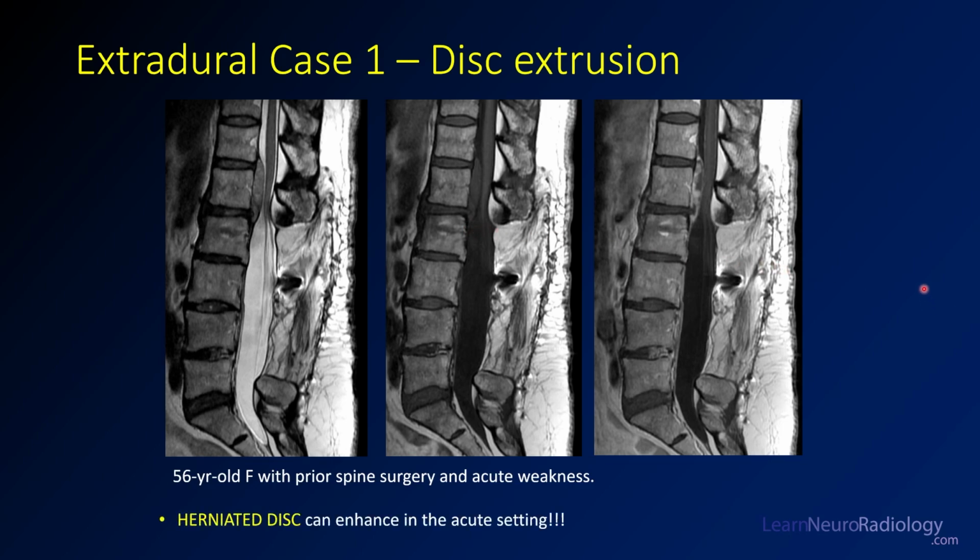Now, don't worry too much if they're enhancing. You can see particularly peripheral enhancement, although in this case, even the enhancement is a little bit nodular. So just don't worry about that too much. Be careful because these can definitely mimic tumors. I see these called schwannomas and meningiomas not infrequently. Just remember that they're really common. So think about those if you see something contiguous with the disc in a patient that has bad degenerative changes or evidence of prior surgery.